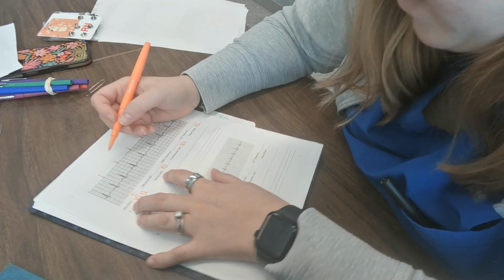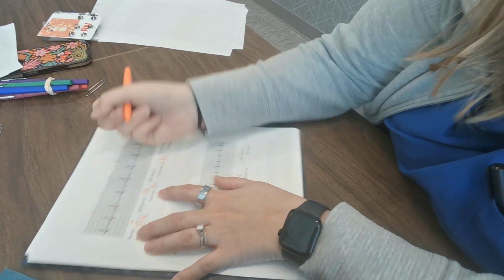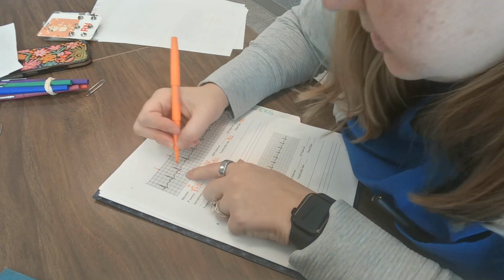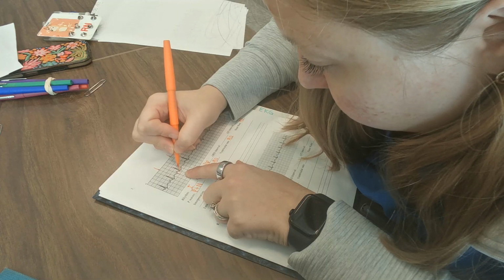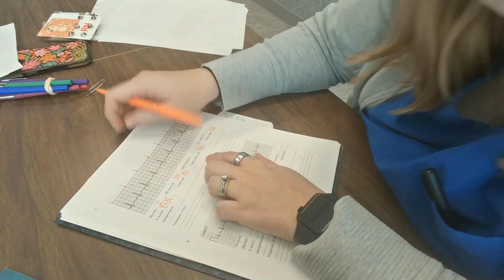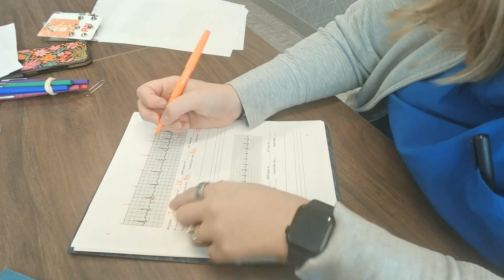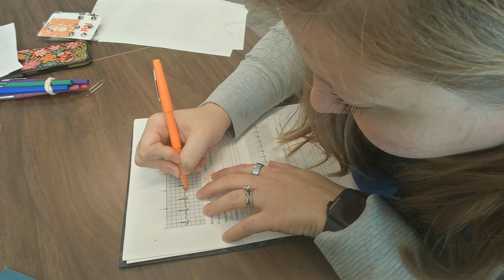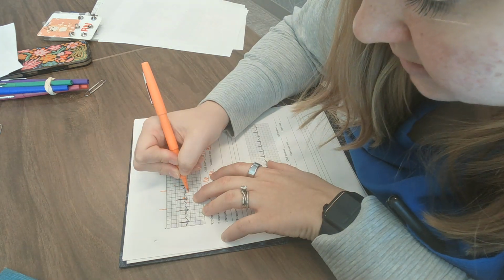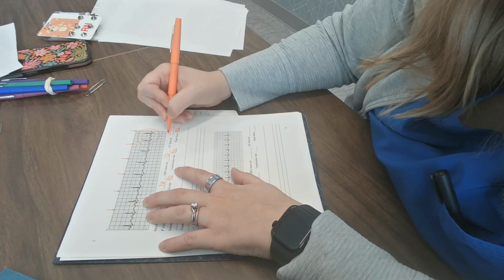Okay, let's look at my PR interval. This one looks like it starts right about on this line and goes to 1 line short. So that's going to be 1 small box short of a big box. So that's 0.16. Then my QRS goes to about here. So that's 1 plus 3, 2, actually. So a total of 3 small boxes, so 0.12. And then my QT interval goes all the way to almost this big box. So that's going to be like 1, 2 big boxes plus 1 small box is 0.44.